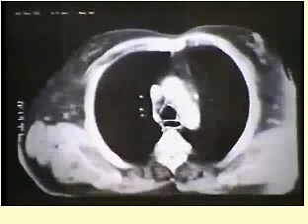But there are some other variants that may present there that are not significantly pathologic, and here's a very interesting example. This patient has a small bump above the level of the left pulmonary artery, which is right here, below the level of the aortic arch. Now, that's not a very big bump, but it's certainly not a normal shadow. What is it? Well, we did a couple of things on this patient, one of which was to do a CT scan.